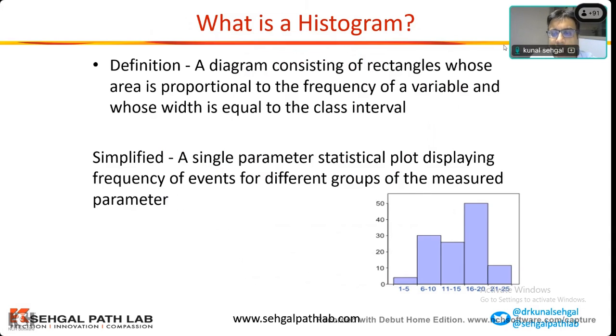And the basic logic is that the histogram concepts across 3-part or 5-part counters, especially for RBCs and platelets, remain the same. The naming of the flags, the wordings may be slightly different, but there is not much of a difference in the concepts. So let's go back to school and understand what is a histogram.